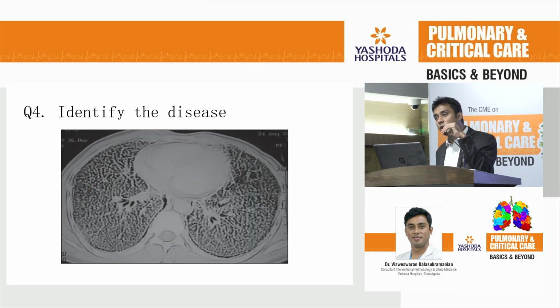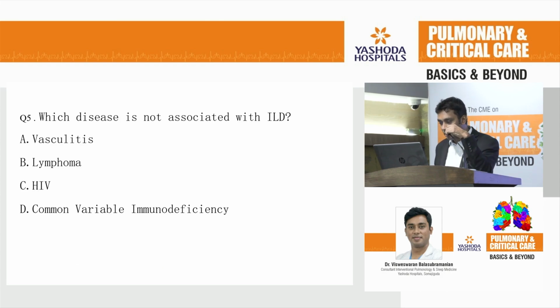It's a case of pulmonary alveolar microlithiasis. What will mimic a bone? Only calcium deposits will mimic a bone. So what you are seeing here is a classical black pleura sign. Okay, the pleura will appear black. This is called black pleura sign, and it's a case of pulmonary alveolar microlithiasis.